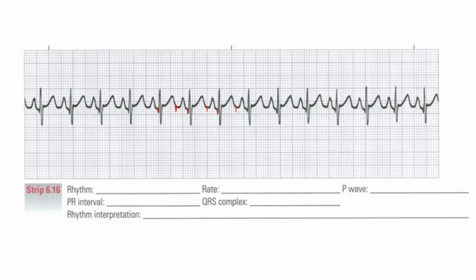So this is a sinus tach, because your heart rate's greater than 100 and you are coming from the SA node, so we are calling it sinus tachycardia. And what do you do for sinus tachycardia? You find out the cause of it and treat the cause, or ask the why. Why are they in sinus tach?